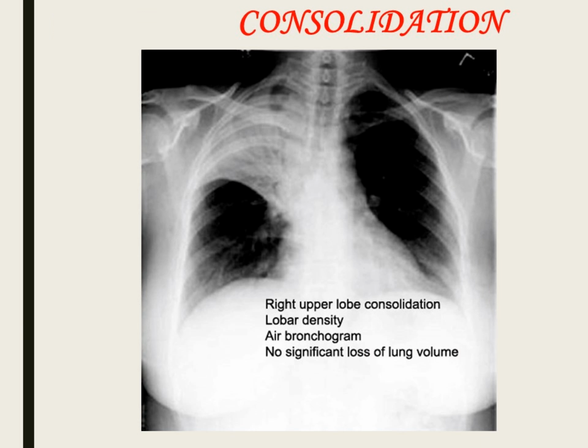All right. So what do things look like? Well, right upper lobe consolidation. Things that are consolidating, meaning there's pus or stuffing like this within the alveoli, right? If it follows anatomical landmarks, it's useful. You can see it following the fissure here. And these little dark lines, always look for those. Those are air bronchograms, right?